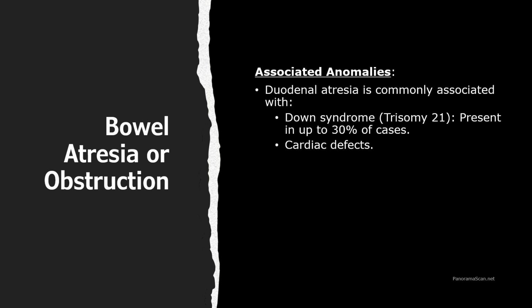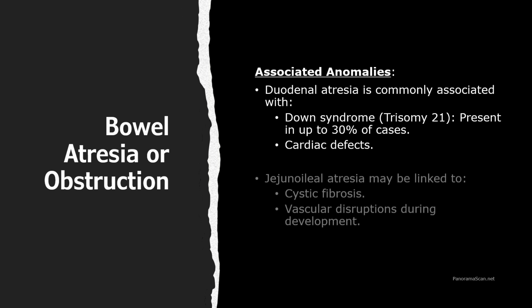Bowel atresia is often linked to other congenital conditions which can impact diagnosis and management. Duodenal atresia is strongly associated with Down syndrome, occurring in up to 30% of cases, and may also be linked to cardiac defects.